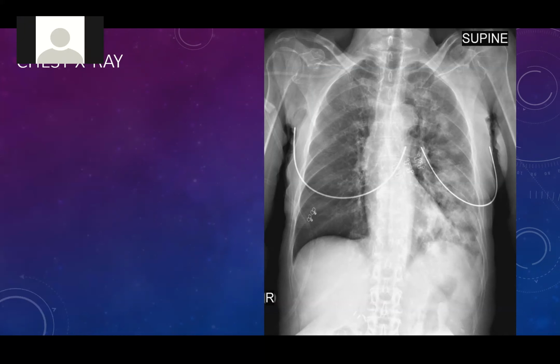It is patchy. She said it is patchy. It's on the left. It's consolidation, she said. It's patches, she said. So it's probably atypical pneumonia, she said. And I said, yes, thank you.